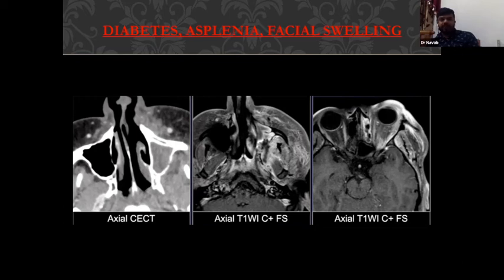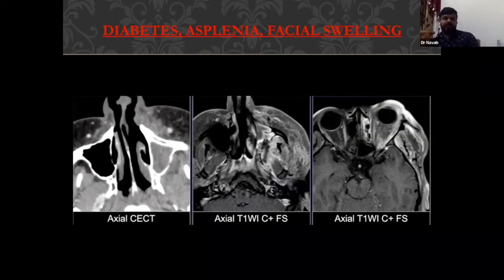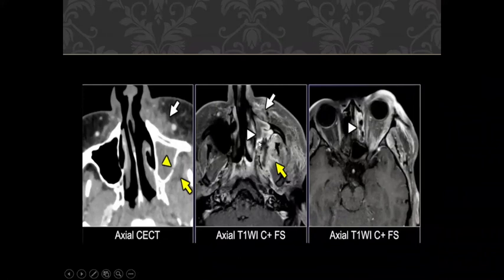Which lesion will we see that in? In mucormycosis. Okay, fungal sinusitis, right? You can see some bony erosion, and you already mentioned there is some soft tissue stranding in the anterior premaxillary and retromaxillary area. You can see some hypo-enhancing areas in the turbinate and also in the mucosa. This is called the black turbinate sign or black mucosa sign. This is seen in fungal sinusitis.